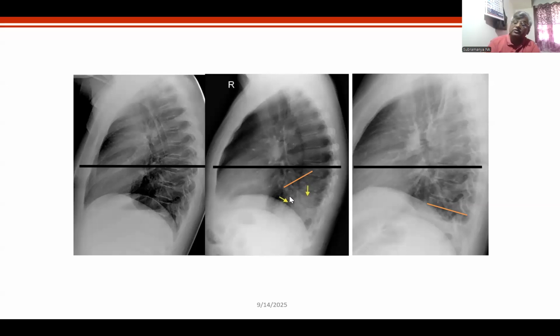Okay, fine. Now imagine this patient taking an AP or a PA film. This is what I meant by missing. Now this is the diaphragm that you see in an AP film. I will just put this down. You take your eyes here. This cuts here, and this goes retrocardiac also, and definitely you will miss a pneumonia of the lower lobe.